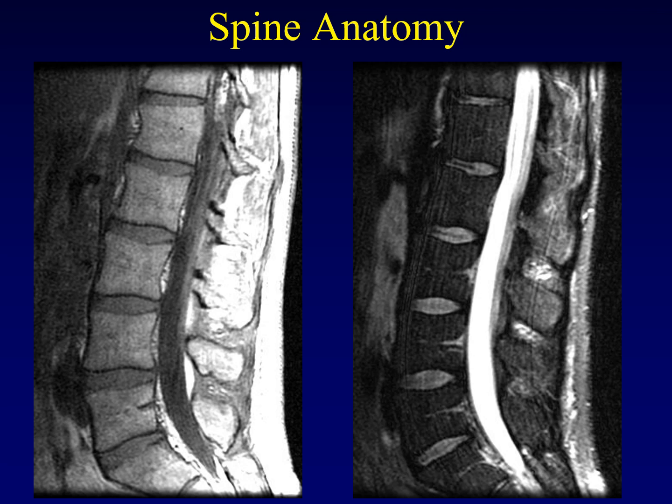Some similar appearance here in the lumbar spine. Notice again that we are alternating between vertebra, disc, vertebra, disc, vertebra, disc. We're going to come back to that later on. Notice also that there is a nice smooth line of the posterior longitudinal ligament that is running behind the vertebral bodies. Notice how smooth it is as it passes from one vertebra to the next across that intervening disc.